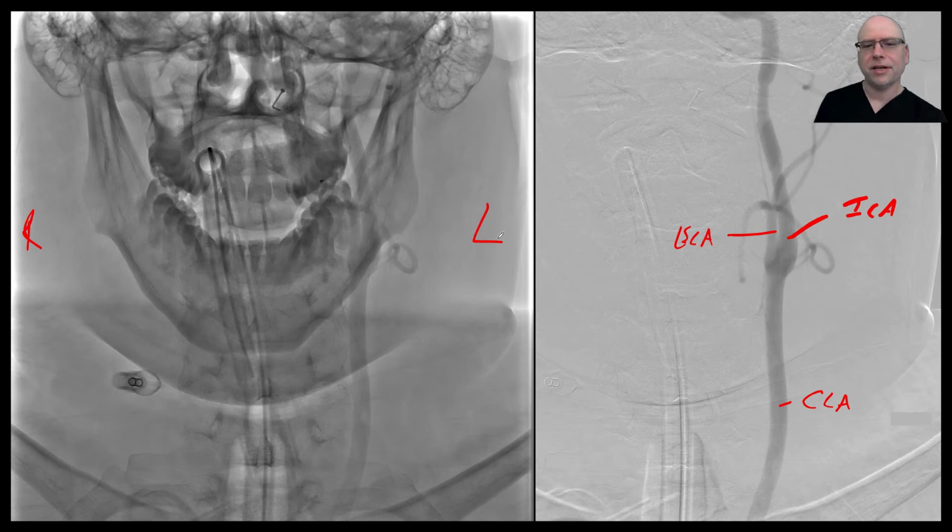It's a little hard to tell from one picture because as the vessels overlap, it's hard to follow. But in general, the majority of the time, there are no branches coming off the internal carotid artery in the neck. So if you can pick that out, it's helpful.